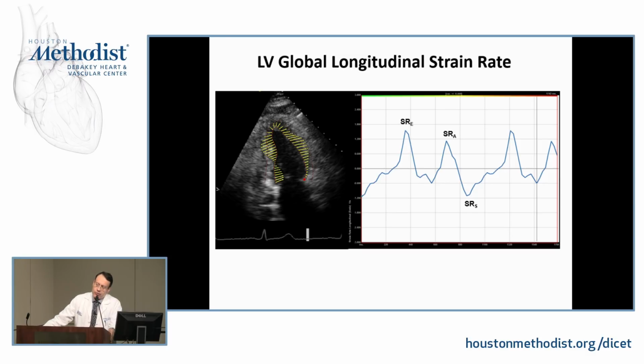There are efforts towards standardization of systolic strain, but little in terms of diastolic strain rate signals. And here it's showing you that with the VVI system with early and late diastole, and this is systolic strain. That signal can also be analyzed and has relations very similar to IVR in terms of direction, but magnitude not as tight.